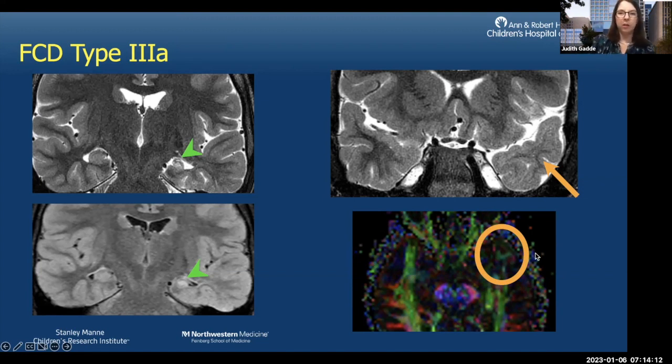So just to have a little caveat here, DTI is not always done in every case in every institution. Of course, there's lots of variation. But at my institution, we currently do DTI when we have ordered or protocoled what we call an MRI epilepsy surgery protocol. So these are patients who have already had a standard epilepsy protocol MR, and they're further evaluating and planning to take them to surgery.